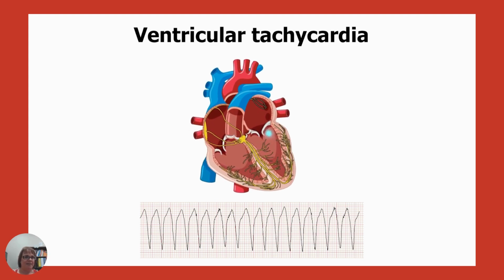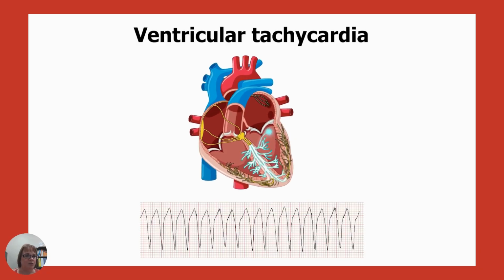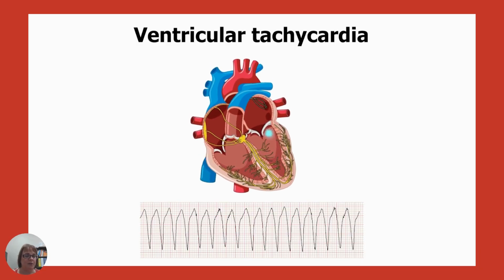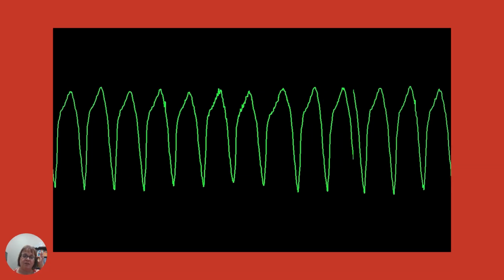So VTAC is a lethal rhythm. Okay, they would have no cardiac output. Your patient would be unresponsive, and you would need to be doing CPR or shocking them. So here, this is what VTAC looks like.